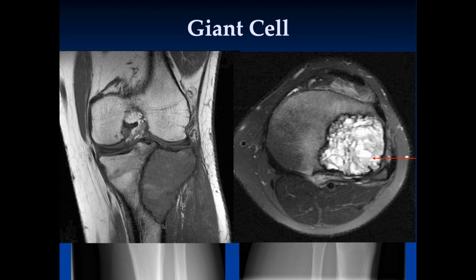So I think it's a giant cell tumor with secondary aneurysmal bone cyst formation, or is it just giant cell? No, it's just a giant cell. If it really gets prominent, then you can call it an associated aneurysmal bone cyst, but this is pretty typical of just a giant cell tumor. Yeah, rarely these can metastasize to the lungs. Usually it's a local resection for these.